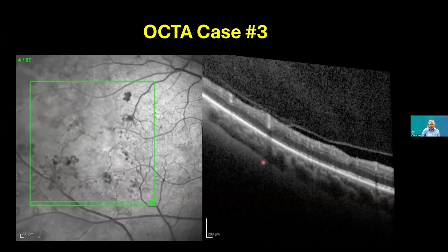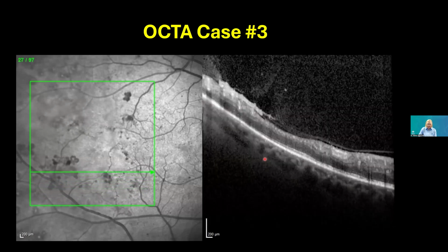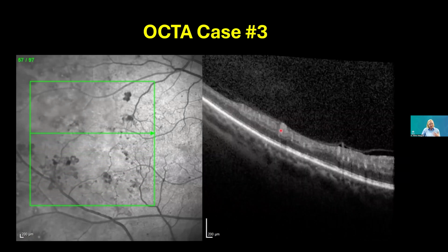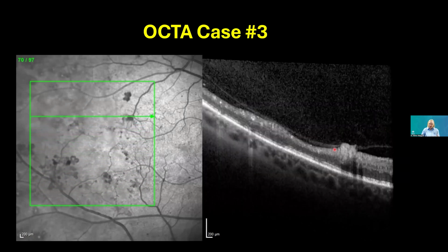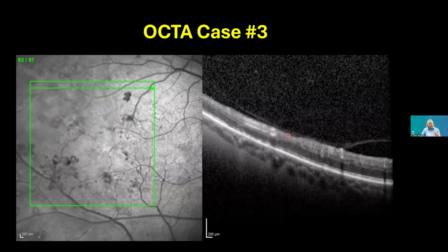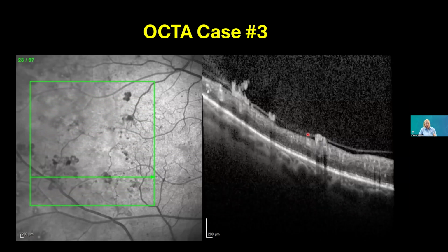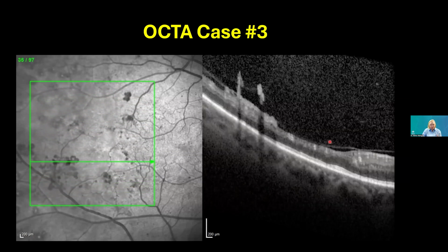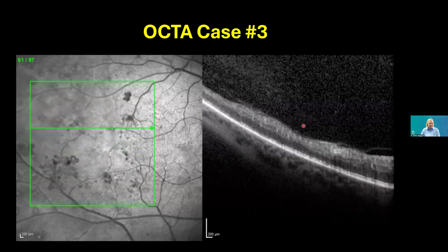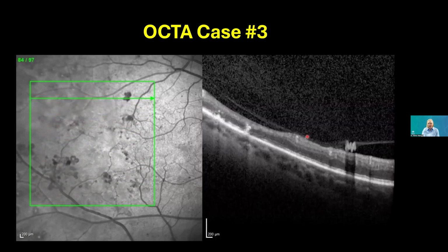And just again to highlight, yes, OCTA is great, but you don't necessarily need it to see the neovascularization. If the neovascularization is close enough to the posterior pole, you can use your structural OCT to do a B scan over that area. This is a very dense B scan. You don't always need quite as dense a B scan. Sometimes getting some more peripheral lesions is easier with just a few B scans. So I encourage you, if you don't have OCTA yet, to still try this on some of your patients where you might suspect neo with your structural OCT.